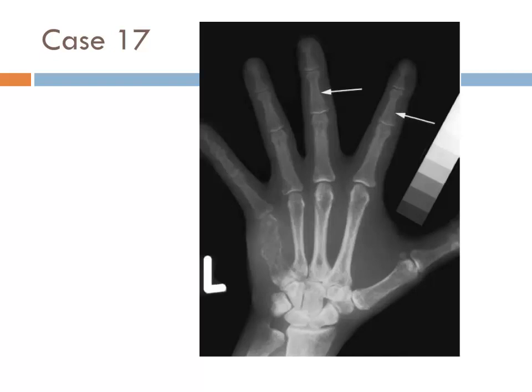It has a different appearance than the other lytic lesion, emphasizing how brown tumors can have almost any appearance. The multiplicity is typical for a brown tumor and limits the differential diagnosis. However, the finding of subperiosteal bone resorption makes any other diagnosis unlikely.